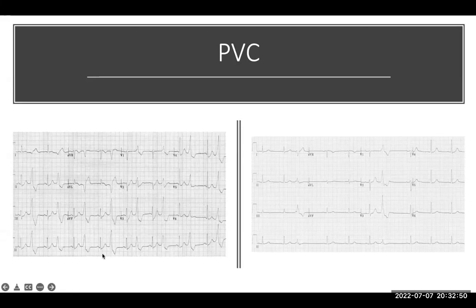If I give you an example here, this is a normal QRS, this is a PVC. As you can see, it came earlier. That's why you use the word premature. Number five, the T wave is always opposite. If the QRS of the PVC is looking up, the T wave is opposite. Number four, is it 4 or 5?